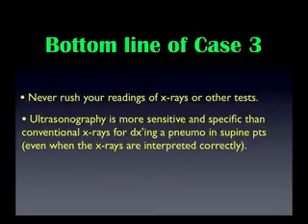And then, of course, ultrasonography is quite sensitive and specific for a pneumothorax and is significantly more sensitive and specific than conventional X-rays. And in this case, we could add even when the X-rays are interpreted incorrectly or correctly.